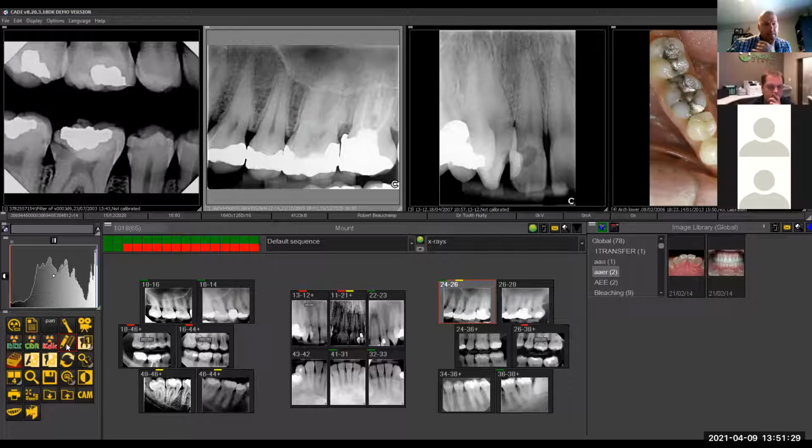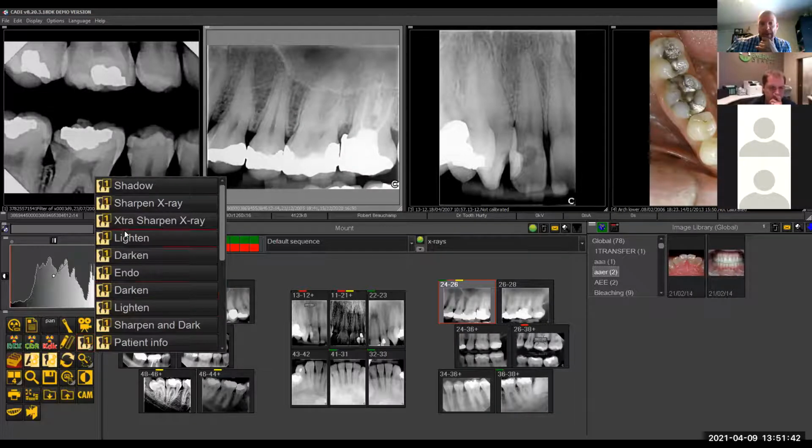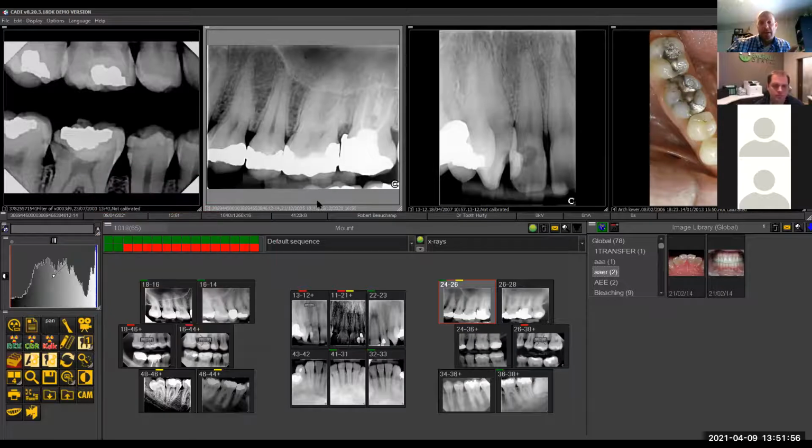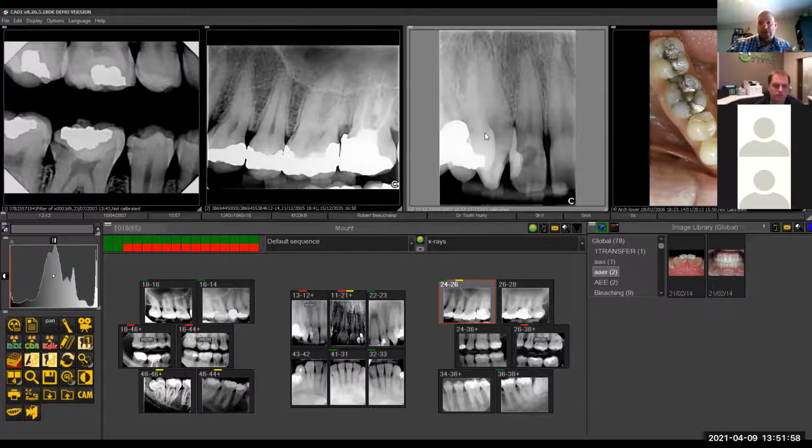And then, like always, we have filtering. You have that all filter tool that I showed you, and then you also have the individual filters. So again, any of the diagonal lines in the bottom of the app, if you just left mouse click and hold, all of those filters that you saw open up in the all filter are individually here. So if there's one that you really like, you can choose it and click on it, and then it will treat the image with those filters.